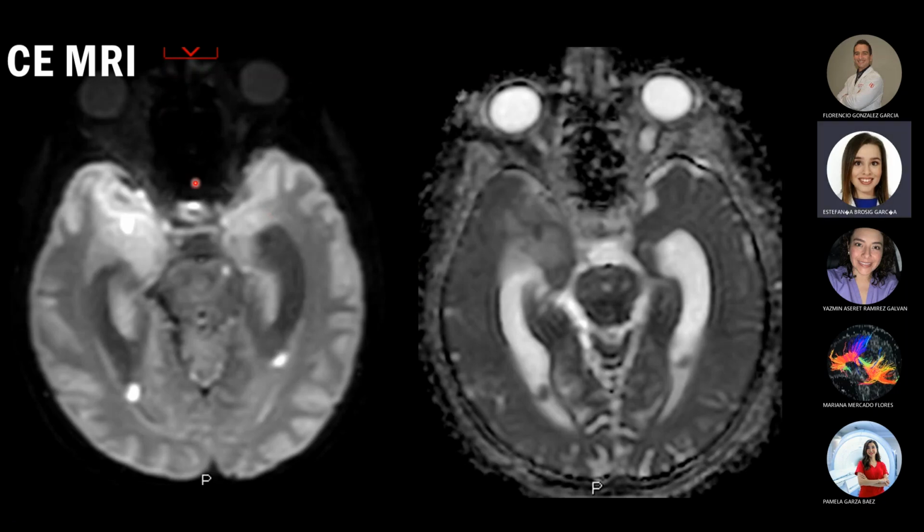In these diffusion weighted images with the ADC map, we can clearly see hyperintensity in the right temporal lobe, with a focal area of restriction corresponding with hypointensity in the ADC map. We can also see restriction in the posterior portion of the temporal recess of the lateral ventricles in both, which we didn't see in the non-contrast enhanced CT or the angio.